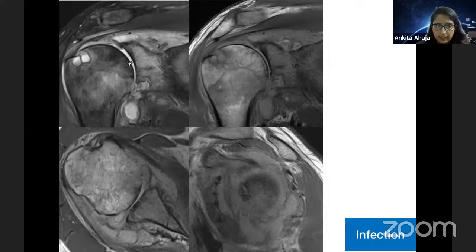So this is your humeral head, and you see a lot of marrow edema over here. And you have a lot of marrow edema over here in the glenoid as well. You can see erosions happening over there. And from the erosion, there is this collection which is coming up. So whenever you see some associated collection, then you're pretty sure that you're dealing with infection. So why is this not the inferior labral recess? Because this is being pushed over here. And obviously, you will be able to see it on the consecutive image as well. So this was a collection which was communicating from the erosion.